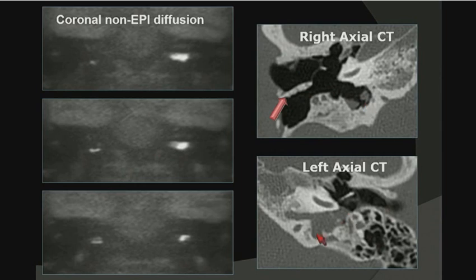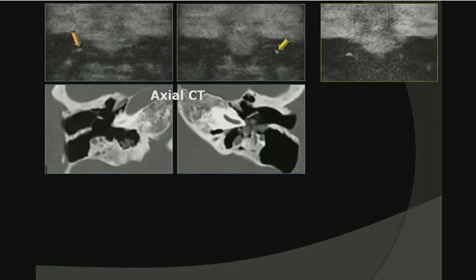Now here you see the congenital cholesteatoma, and that congenital one is going to attack the ear, so you're going to have a deaf ear. So you should first operate that. That's what our surgeon did. He went in and he took away the one on the left side. But you see on our control MRI, there's still residual also on that side, so he missed something.